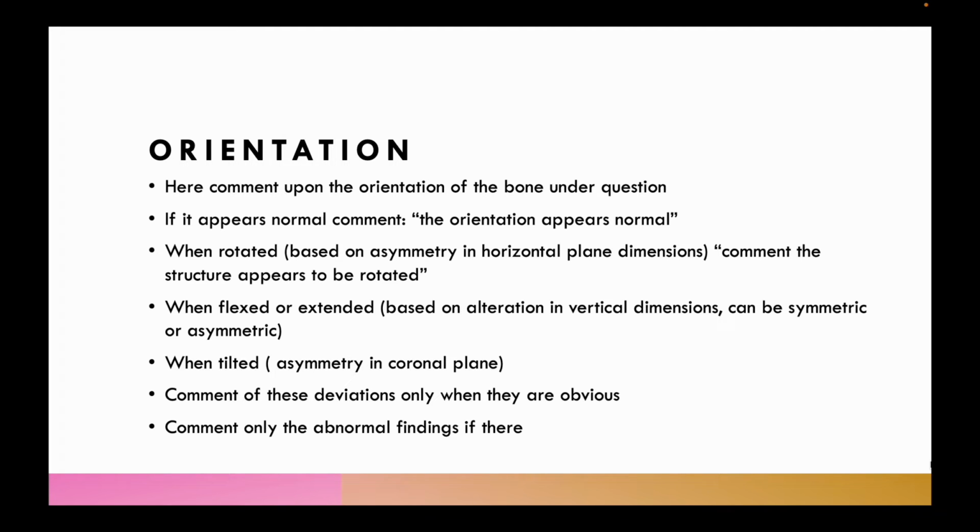So if the patient is having flexion deformity of hip joint, and when the radiograph is taken, the limb is kept in neutral position or in a slightly flexed position, the pelvis is automatically going into extension to compensate for the correction of the flexion deformity. That means it is going to tilt backwards, or we can say it is going into extension in a simple word.